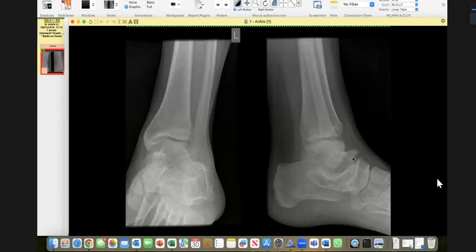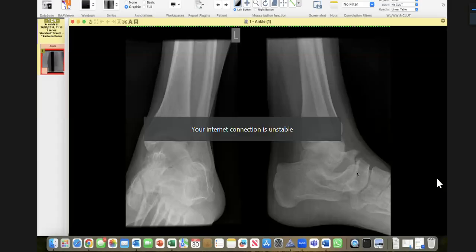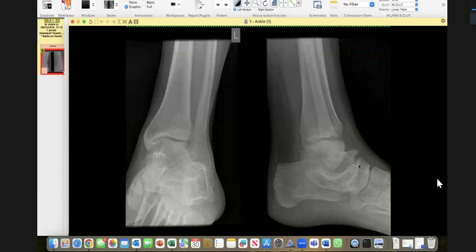No, sir, I am talking about this. So there is a projection from the talar bone, a beaking of the talar bone, and there is a coalition of the talar bone. Yes, sir, I'm talking about this beak, which you just mentioned.